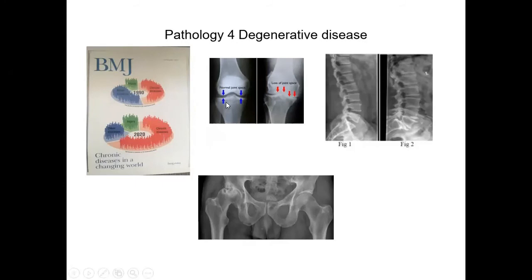Well, we see degenerative joints. Here's normal knee space, the lateral and medial compartments, and here's loss of the joint space of the medial compartments, sclerosis, osteophytes. This joint doesn't work. Not only does it not work, it causes incredible amounts of pain and disability. These patients are quite lucky because they can have joints replaced. If you have a bad back and lose a joint space like here, you cannot replace the back. This can be incredibly painful and quite disabling.